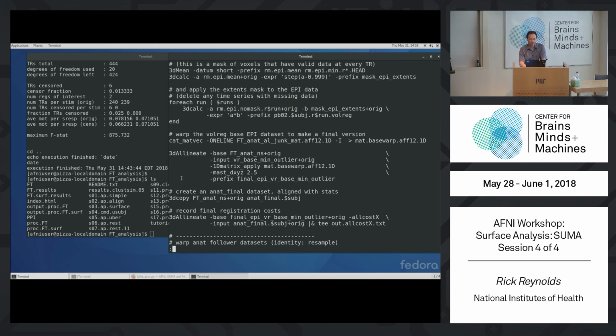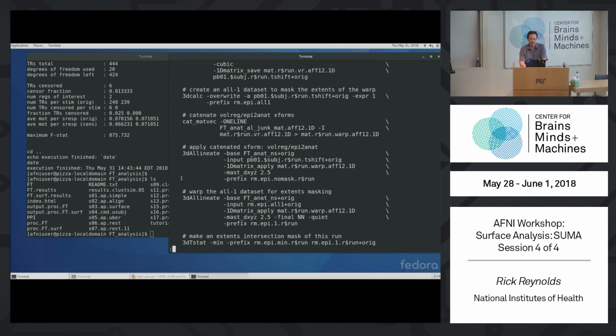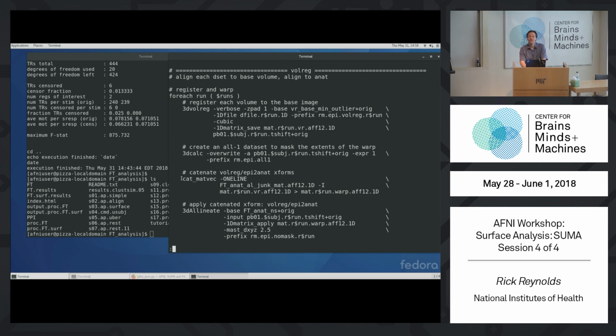What about the volume registration parameters? Same or different? These are the same, yeah. These are the same because, again, the lack of the TLRC step has not yet impacted the EPI data, and we're just running 3dvolreg like we did on Tuesday. Here are the transformation parameters. Since there's no randomization involved in this, and unless there are some bugs in the code that produced inconsistencies, these will be identical to before.